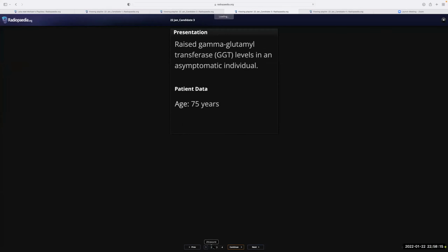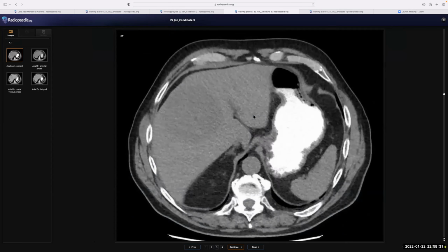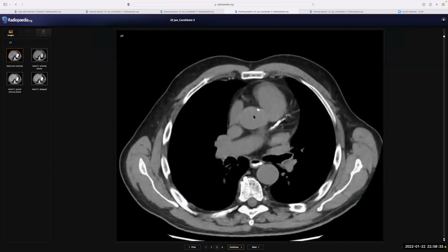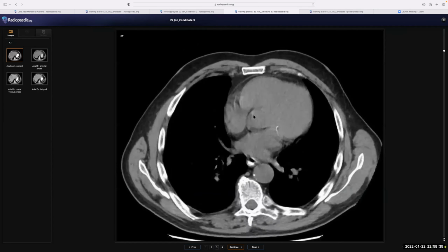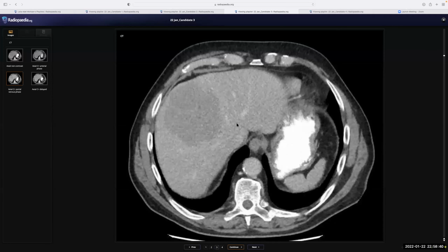So this is the case I wanted to tell you about, scroll all the images. This one is a single image, but I don't think this is cystic because there is a hyperechoic content here. Okay. I believe this is solid even on the ultrasound. And again, when you find a scrollable image, you say I will scroll in a systematic craniocaudal direction. This is what I also said in the exam.